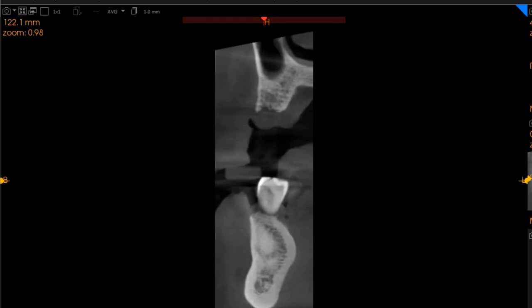Now on the top left, first premolar region, that's where we have significant bone available. We've got approximately 9 millimeters of ridge height and 7 millimeters of ridge width. Moving to the second premolar region here, the ridge becomes quite significantly shorter. We've got 8 millimeters of ridge width with approximately 4 millimeters of ridge height. So a sinus lift will definitely be needed in the upper left side.